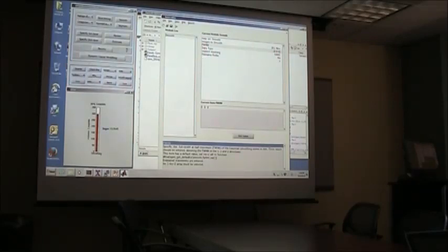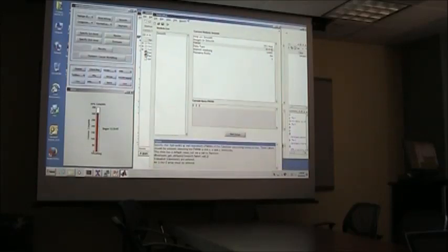One is within SPM, which I've done here. So you would go to your batch editor, click batch, and then file, open your saved batch.